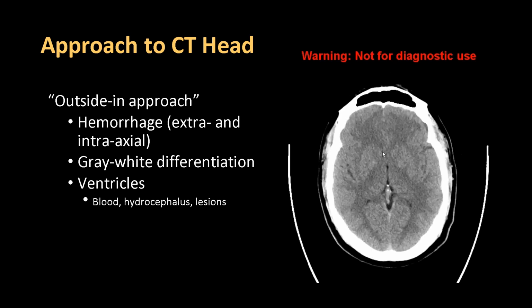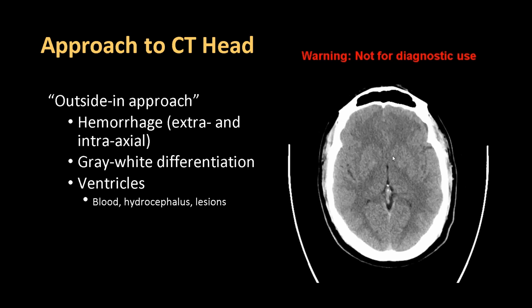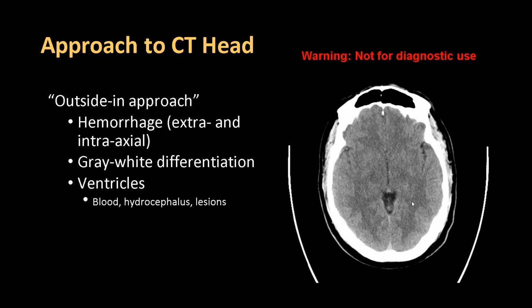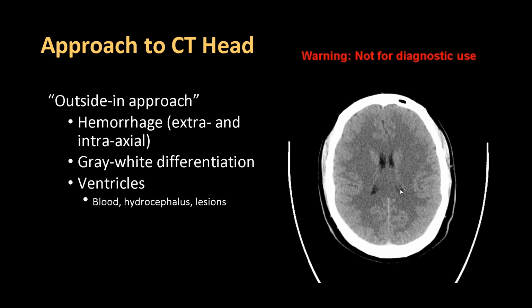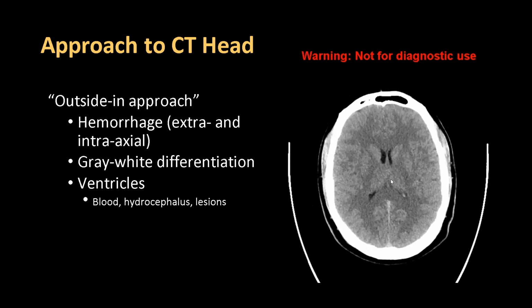I would start at the top and just scroll through the lateral ventricles and make sure that they're normal in caliber, which in this case, they're nice and small, decompressed. I can't even follow the ventricle all the way to the temporal horn, which is normal in a young patient without hydrocephalus. And I want to look for any internal hyperdensity, which could suggest blood, or any mass within the ventricles, which I don't see any of.